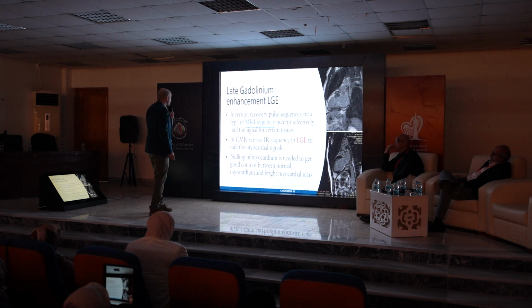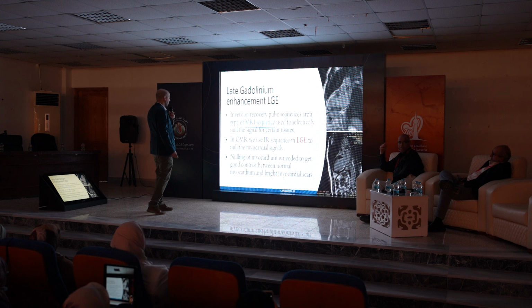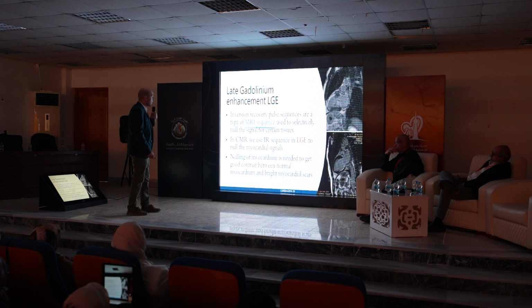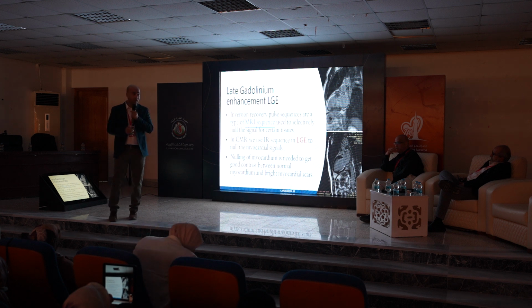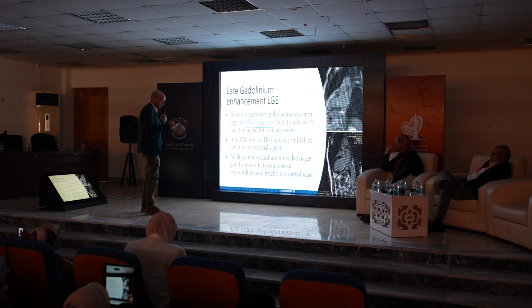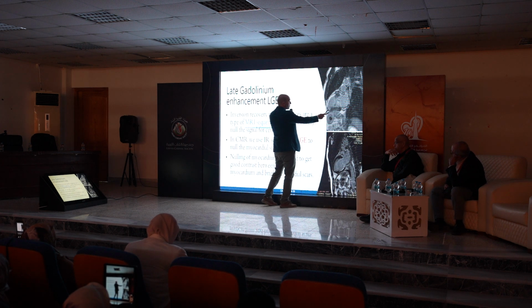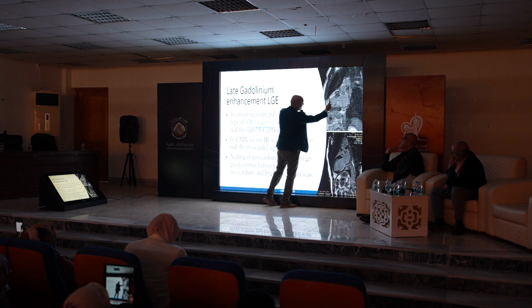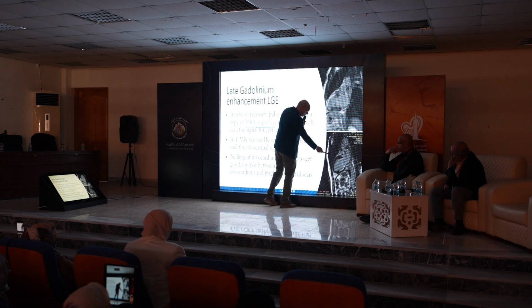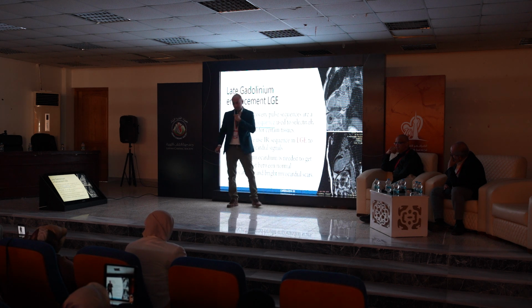Late gadolinium enhancement is a special type of sequence called inversion recovery. We use it to null, or to make the myocardium black, so the enhanced scar will be visualized clearly. In this case, that's a late gadolinium enhancement with a nearly transmural scar, which is enhanced. In this one, there is a subendocardial scar in the inferior wall.